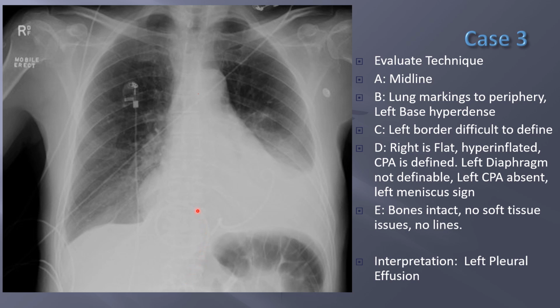And here, it's a pretty odd catheter. It's kind of like a little pigtail, in kind of an odd spot. It might be trying to get into the space and drain that fluid, but usually it comes from this side and kind of curls. But I'm not quite sure why it's lying on the patient's abdomen. So this is a kind of unusual presentation. So there is some sort of hardware here.